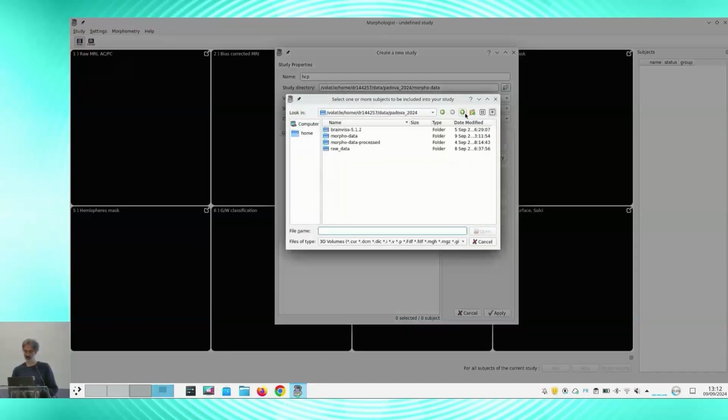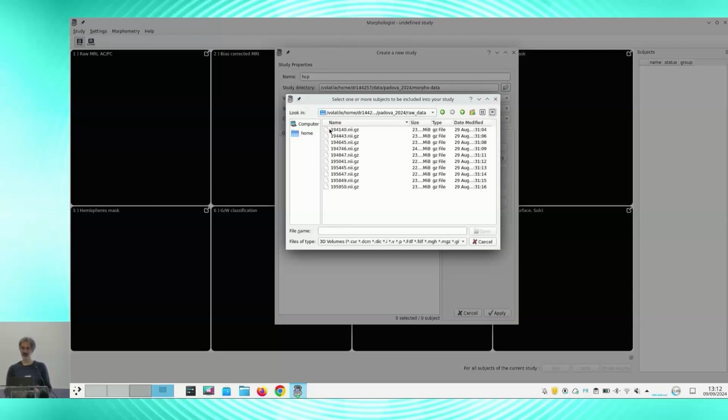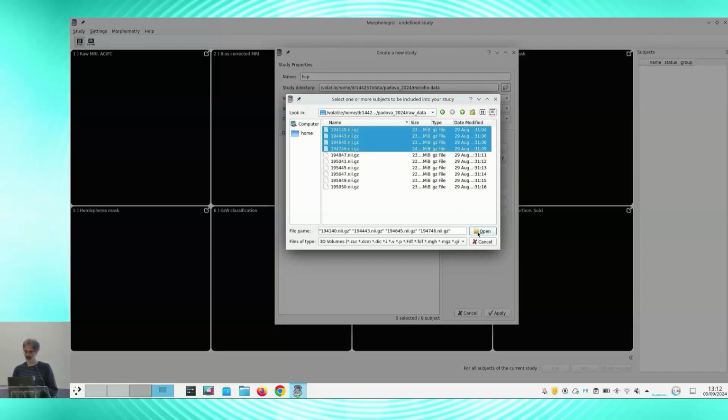In the little data sets that I have shown, there's a raw data directory where I can take images. I have prepared 10 different images, but for the demo I will use only 4, because I will run on my little laptop, and it will take a bit of time to process. So we'll take only 4.